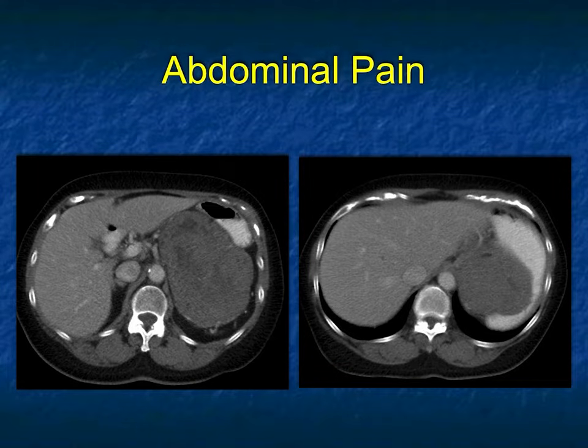That's a possibility. You could be dealing with a retroperitoneal sarcoma, which is growing upward. That's a definite possibility. This lesion is really well defined and probably involves or arises from the stomach, which is best seen on the image on the right. So one of the things I need to think about is a primary gastric lesion. This is not going to be the look of adenocarcinoma. It's not going to be the look of lymphoma. It's the look of a GIST tumor.